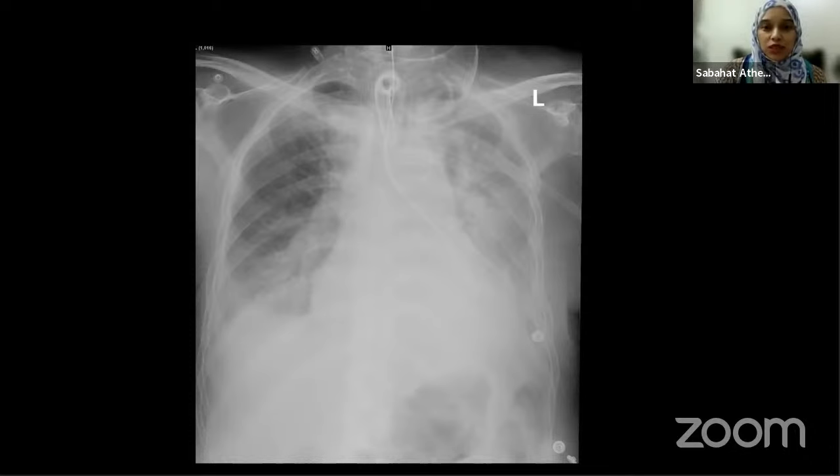Okay, let me show you. Can you see my arrow? So this is the tracheostomy tube, right? Now, can you see the NG tube? Where is the NG tube going? The NG tube is going into the left lower lobe bronchus. Can everybody see it? So this is a misplaced tip of the nasogastric tube. So what do you do regarding this patient?